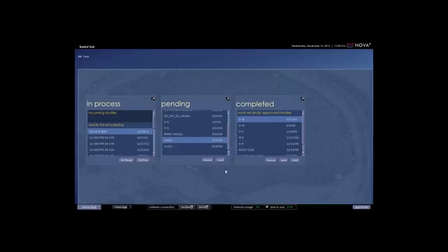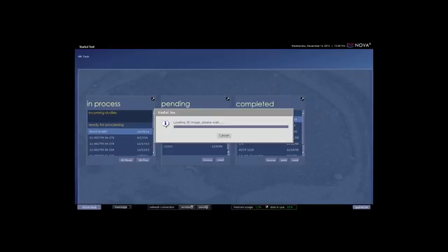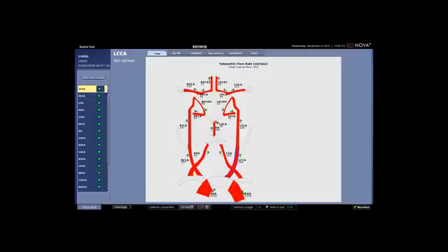And we can browse it. So let's go ahead and now browse this completed study. So we're going to load up all of our images. Here's the report again, the vessel map. We'll take a closer look at this now.